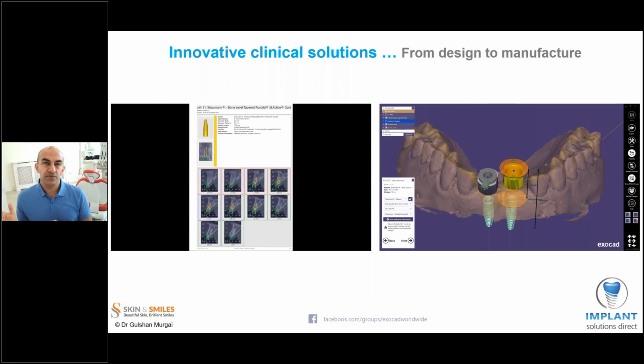The next stages from here are part of what's called the guide creator module. So the middle step in between is this step that I'm going to show you on the right-hand side screen there, and that is the positioning of the sleeve. The sleeve is still the responsibility of the person that is planning the implant positioning. And that's because the positioning of the sleeve is designated by the drill set that the surgeon is using.